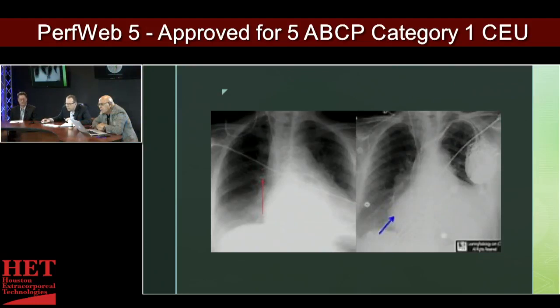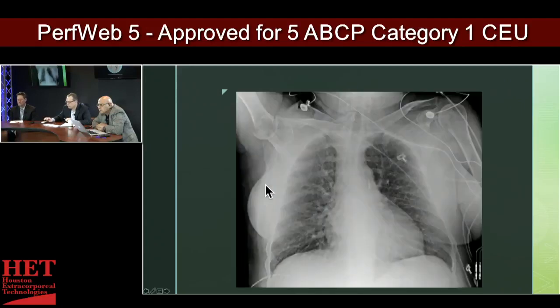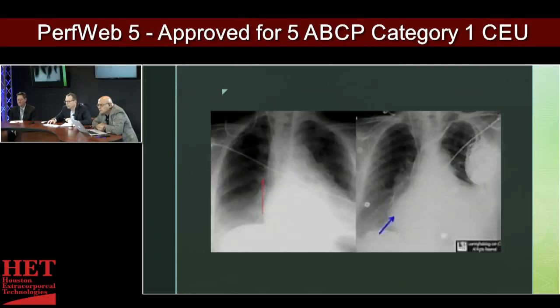This is a catheter in the red tip here. This is the pulmonary catheter heading straight out. And I'm not sure what they're pointing out here with the blue arrow. I think that in this projection you can't see it, but it takes a coil in the atrium as well, which you obviously want to avoid. Yeah. You don't want to tie it in a knot.